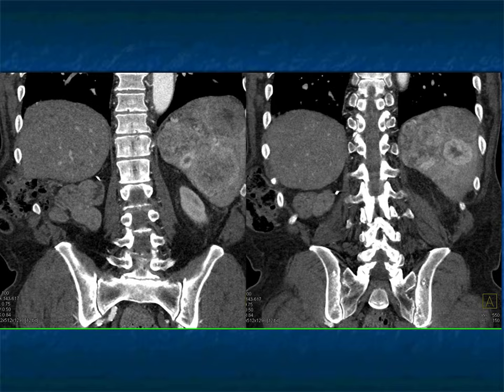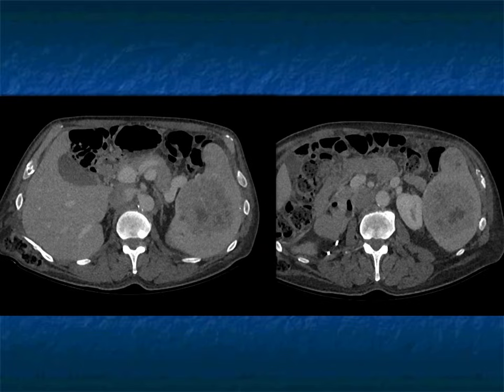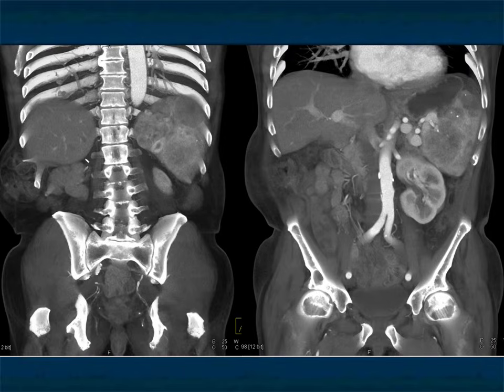Clear cell renal cell carcinoma, whether it's to liver, to pancreas, to muscle, to bone, to kidneys, or spleen, will often be vascular. I've not seen many of these cases, but this surely is the best one I've seen. And here you can see the lesion washes out on delayed phase imaging and why the arterial phase is so important, though surely on the venous phase alone, you would have been able to see the metastatic disease present. Again, really nice example.